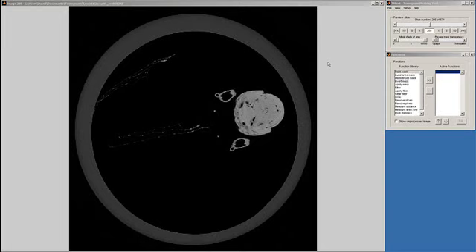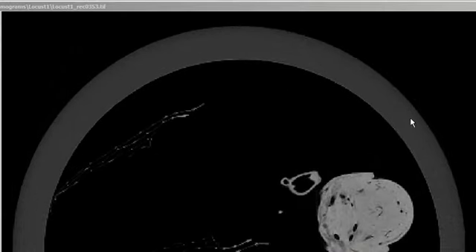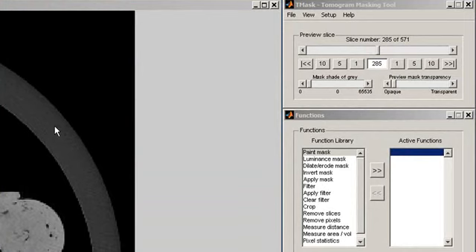When these image slices are reconstructed into a 3D view, we find the image of the locust is obscured by the specimen tube. To improve the view, we need to mask the tube by setting the pixels of the tube to the background color, that is black.